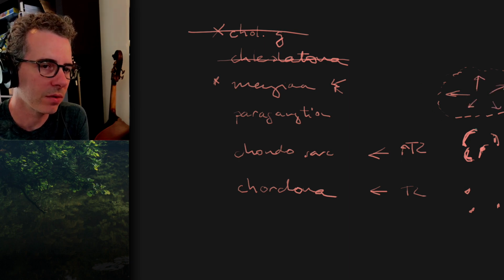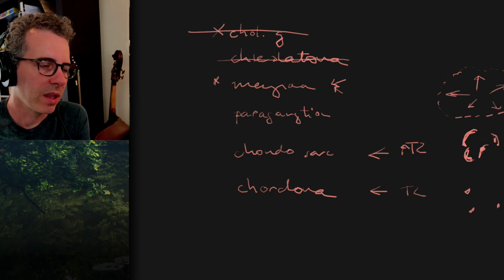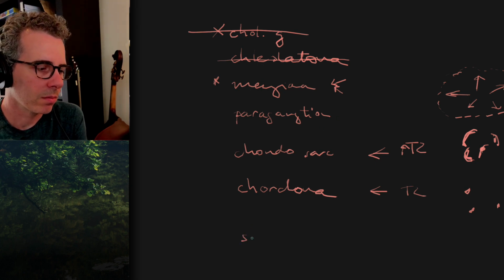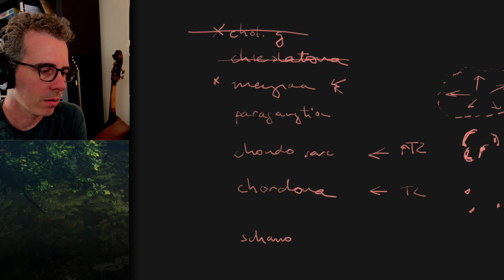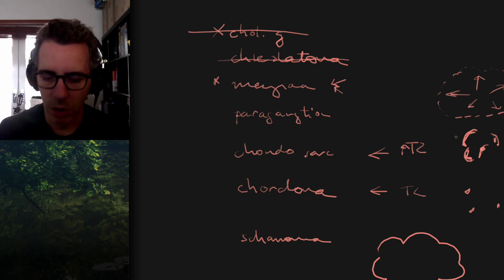And why is that a useful sign to compare to what other lesion that we usually think of when we're thinking about paragangliomas? What's the main differential? A schwannoma. Yeah, and that would be smooth remodeling, not looking nearly as aggressive or erosive. Yep. Nicely smooth, scalloped margins.